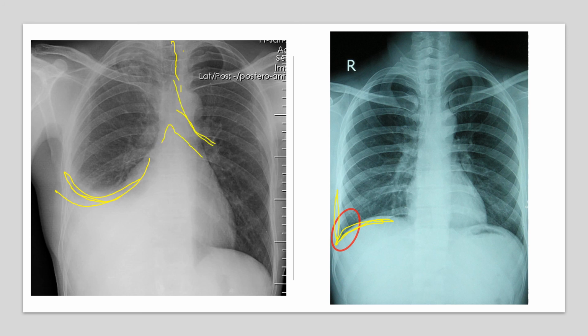And then this is me just highlighting the trachea and the main stem carina. Once again, you notice that the left main stem is a little bit flatter of an angle than the right main stem there. I always like to identify the trachea and the main stem, especially because that can tell me how severe a condition is.